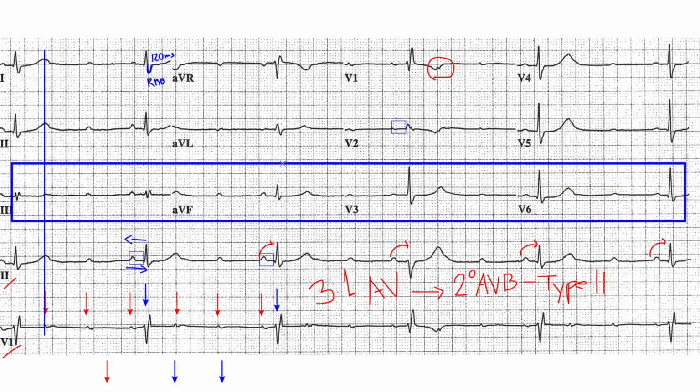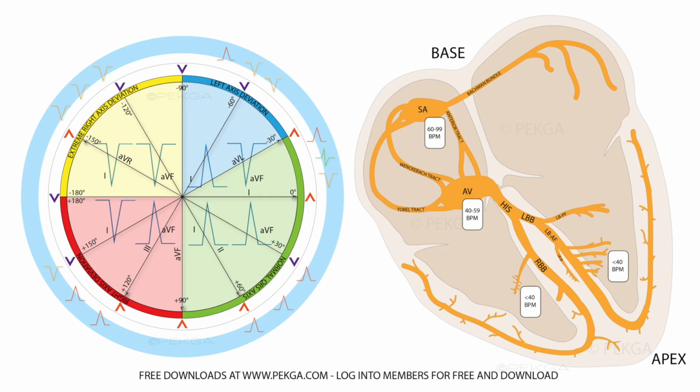Every time you see this, call it that. That's memorization of hieroglyphics. So you're looking for pattern recognition. That's okay, but if you want to be a serious technician, if you want to understand what you're doing, forget about that. Use it sparingly, if you will.